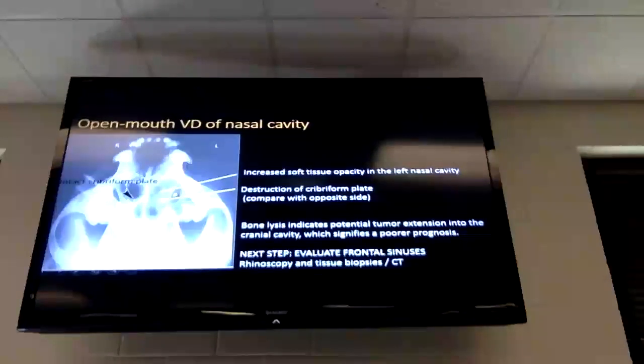And then you have to identify what radiodensity it is. So remember the 5 radiodensities? Air. What's next? Fat. What's next? Soft tissue or fluid is the same. What's next? Bone. And then the last one is metal. So this, what opacity are you going to call this?